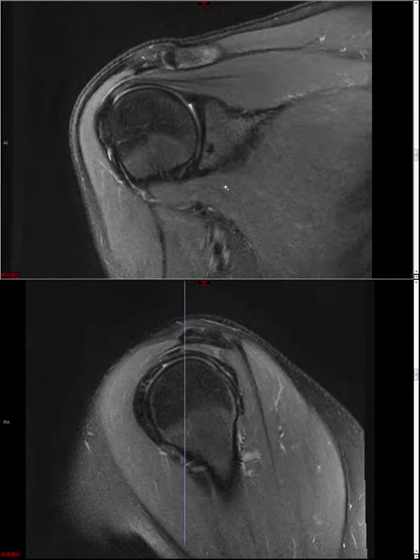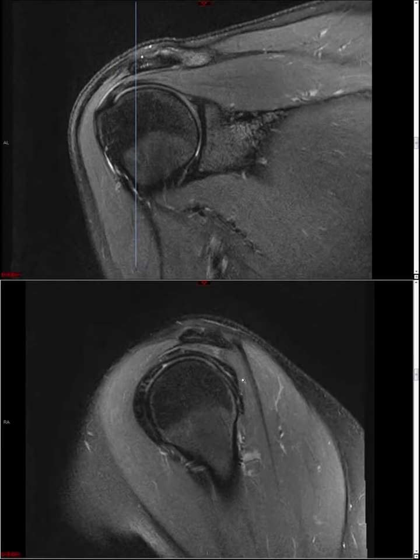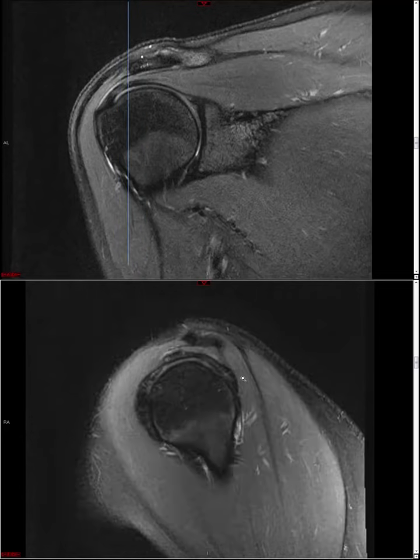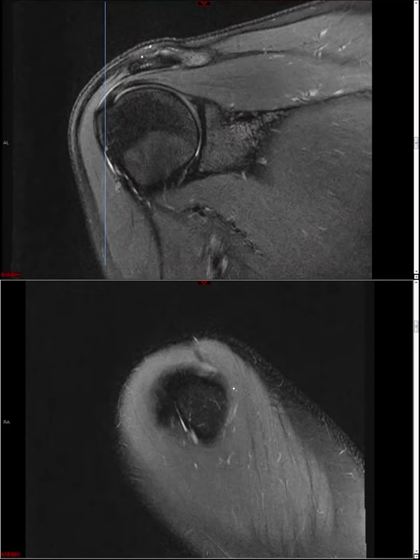Okay, great. Pitfalls. Let's see, there's one pitfall that comes immediately to mind. Let's say we have a far lateral sagittal image like so, and we see only fluid signal here. Only fluid signal, okay? Let's go lateral one more image. Just fluid signal, so based on what I just told you, you would say, oh, it's a full thickness rotator cuff tear. But before we do that, we should actually immediately correlate with the coronal.